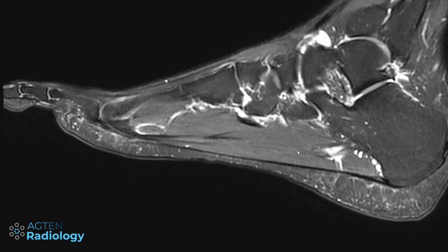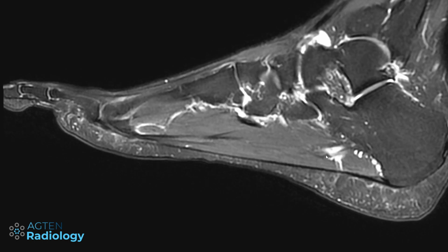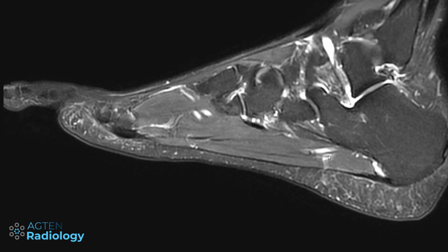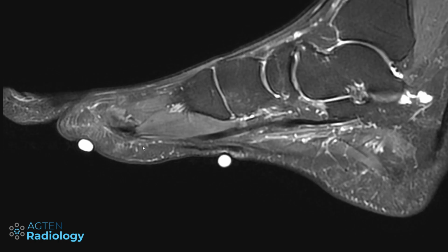And I think the depiction can be easier if you focus on perivascular edema. And then if something's wrong in the vessel, there might be an indication that you actually are looking for a thrombosis. And then we see 2 pain markers. Sorry about that, stupid phone.